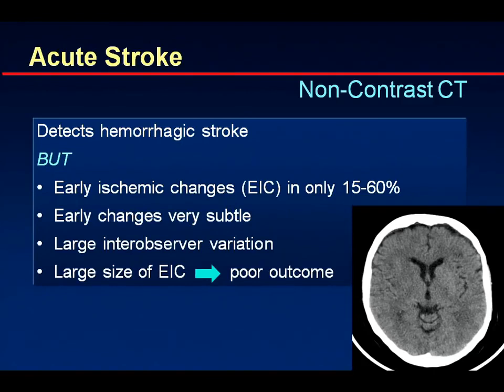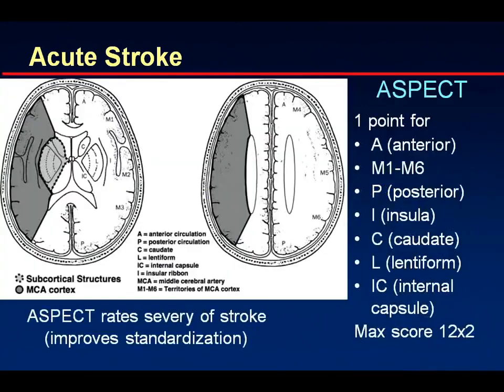Yeah, left frontal might be. The right side could also be something, but if you look at the basal ganglia, you see that you do lose them in this area. But if you would say something's going on here, I would not say no. It shows you how difficult it is in these early stages.